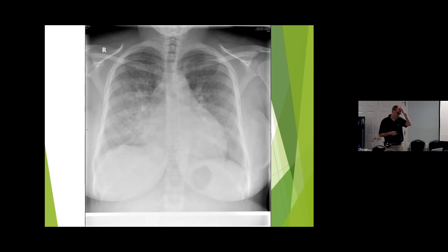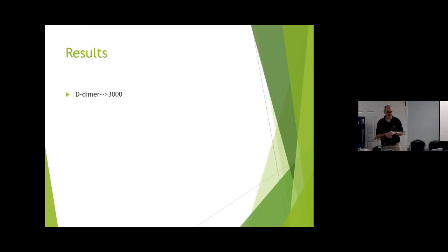So this is her chest x-ray, and it just looks horrible. There's stuff everywhere. Her lungs aren't clear. There's fluid, edema, consolidation just everywhere on this patient. So she got a long workup. She got a bunch of nebs. She got treated for asthma and didn't get any better. She got a CAT scan. Her D-dimer, looking at blood clots, was high, right? Heart failure markers were high.